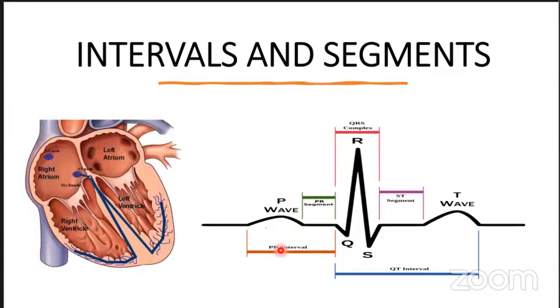So that's for all of the activities happening within the atria. Now let's go to when the current moves into the ventricle. So now the current has gone from the AV node into the ventricle. Even though we're not going to break it down, again, the ventricles depolarize in 3 stages. So you're going to have septal depolarization, which is going to give us our Q wave.